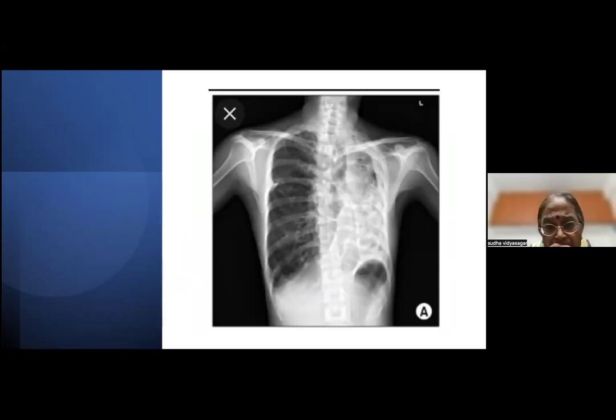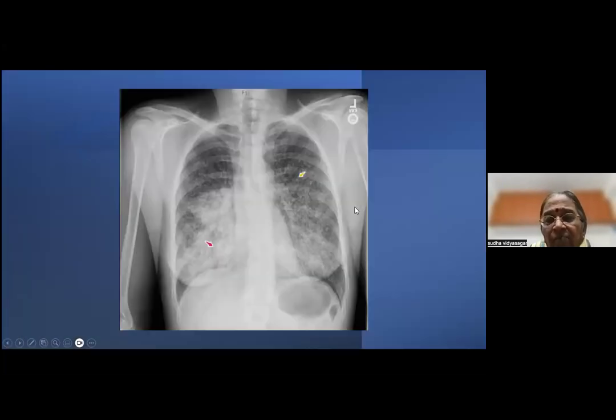Okay, one more destroyed lung, because I wanted you to understand tuberculosis in all its manifestations. So it's one more destroyed lung with the trachea completely on this side and all these cavities going on. One more miliary, just to finish. And you can see multiple small cavities also, and some amount of consolidation happening somewhere. But these look like miliary.